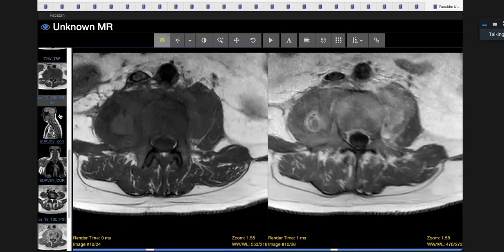We don't see that much of this here, but I have a few cases. What I know of it is that it's usually consecutive thoracic vertebrae, and it's more the bone that you'll get the edema in, and the disc sometimes is spared, and then you get these big paravertebral abscesses and lesions, and they can track all the way up and down the spine and even into the neck.